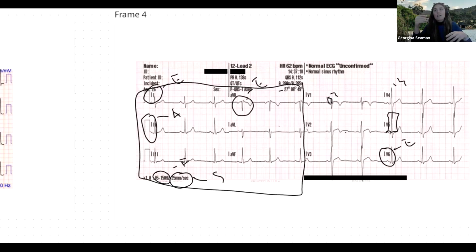It's not just that everything is normally traveling towards lead 2 as it should be. It's that everything is traveling to lead 2 as it should be, but also we see depression or elevation somewhere else. And that's what gives us the hint that that might be that area of the heart that's impacted. Okay. Kind of got that.